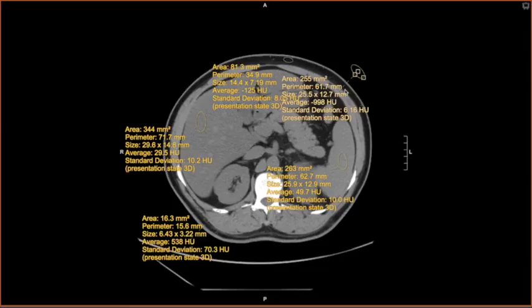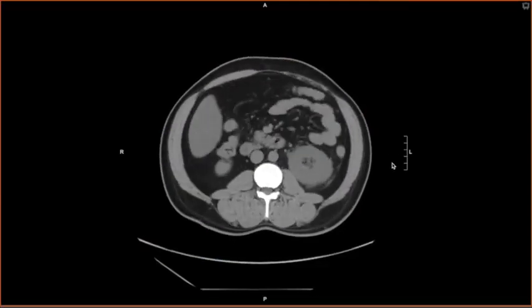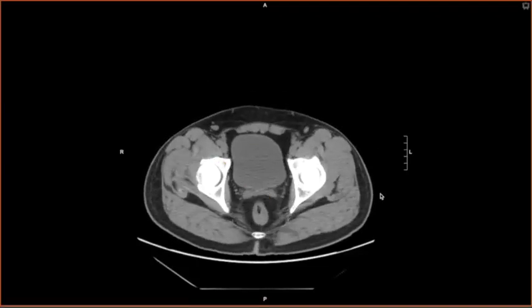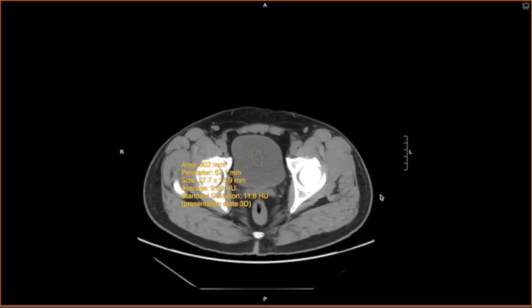Okay, moving up to the higher density structures, we have the subcutaneous fat, which is shown as very dark tissue right here. The average here is -125. Our ballpark number was -100. Moving down towards the bladder, it should mainly be urine or close to water there, and we have a lower density, about 9 or 10.